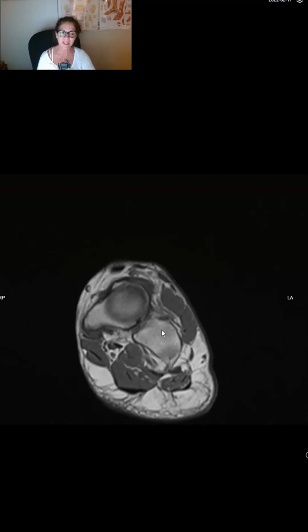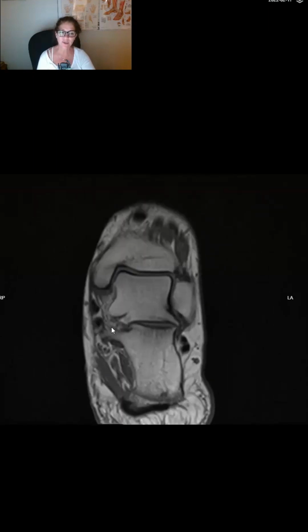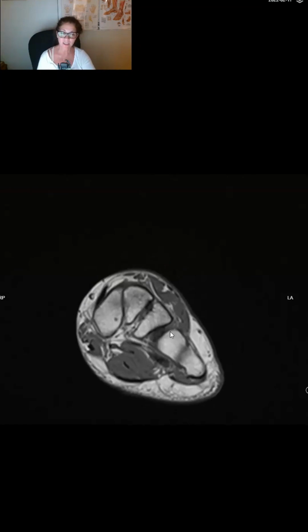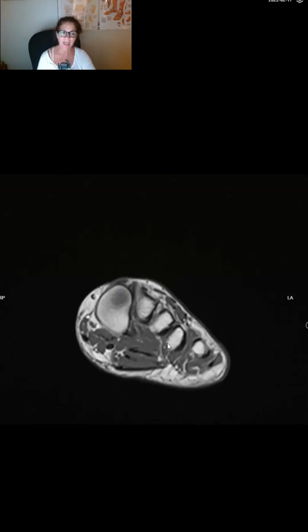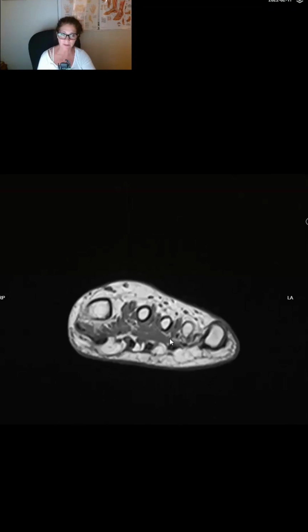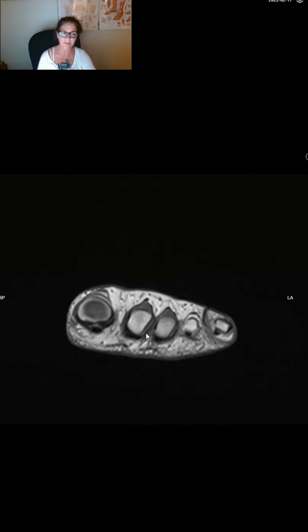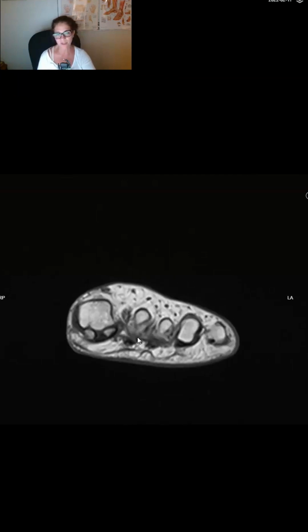So putting it all together, what I'm seeing is an extra-articular anteromedial talocalcaneal fibrous coalition, and I'm seeing a sprain between the cuboid and the lateral cuneiform with stress-related edema. I'm seeing some degree of atrophy along the deepest layer of the muscles of the foot, and I'm seeing a second plantar plate low-grade partial tear, fibular side, distal phalangeal attachment.